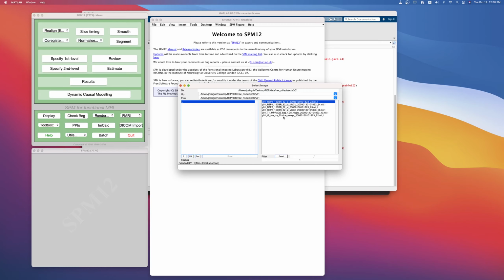So these are all the files here, and it will be helpful to know that the files have some weird names here. If we just focus on the T1 image, that's usually the first one we want to inspect, the T1 structural white matter, gray matter image. You'll notice that there are these file names of the original NIfTI files, and then they add a comma 1. What this means is that your file is one file, but in that file there may be different frames.